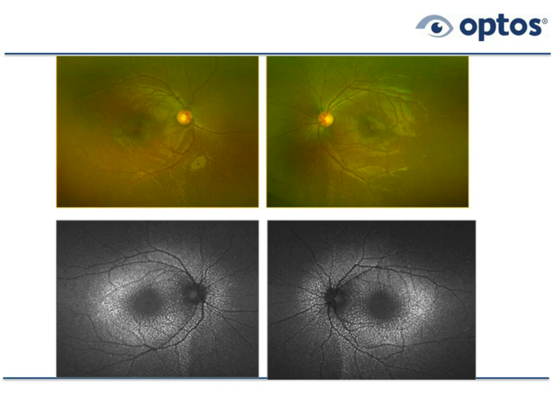By the way, none of those reflections off the internal limiting membrane show up in the autofluorescence patterns, which are below. In addition, if you look at the right eye, which is on your left, 3 disc diameters below the disc and slightly nasal, you see a lesion that's probably hard to define. However, that same lesion doesn't show up on the autofluorescence, which is right below it. That tells us that that lesion is most likely in the inner retina, not in the outer retina. The retinal pigment epithelium is in the outer retina, and the retinal pigment epithelium becomes abnormal, as you know. In this sense, this lesion disappears with autofluorescence, so it's actually just reflections off the internal limiting membrane.